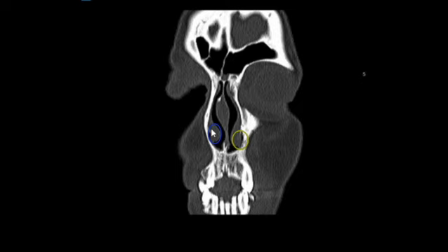So these are the inferior turbinates. As you can see, the left eye is almost completely seen, however, we have not even started seeing the right eye. This is what I was saying about the person being slightly tilted and we have got a twisted image. You don't need to worry about it.